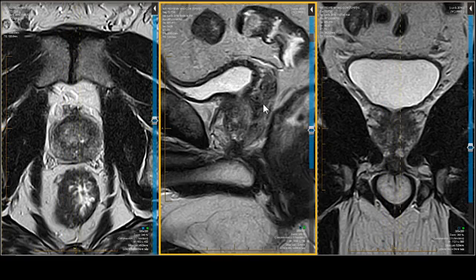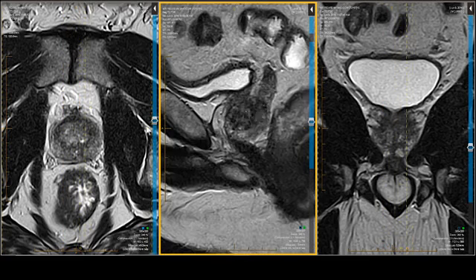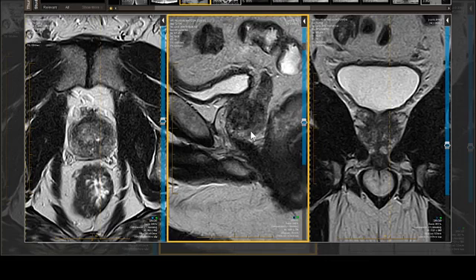Now, how about the peripheral region of the prostate? That's a little bit tougher in this case, because this patient has a slightly hypointense peripheral zone. We see it as a J-shaped structure right here. It's a little darker than usual. But nevertheless, that is not a criteria for a cancer. In fact, that's a scoring system peripheral zone criteria 2. Not a PIRADS 2. A scoring criteria 2 for the peripheral zone. What's the scoring criteria 1? Uniformly bright signal intensity in the peripheral zone.